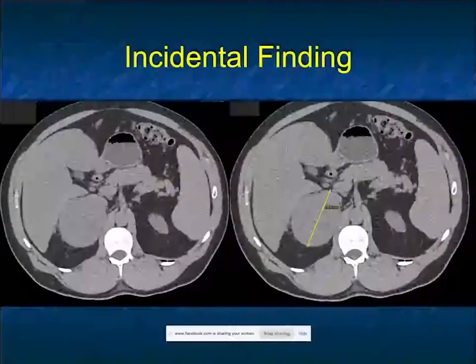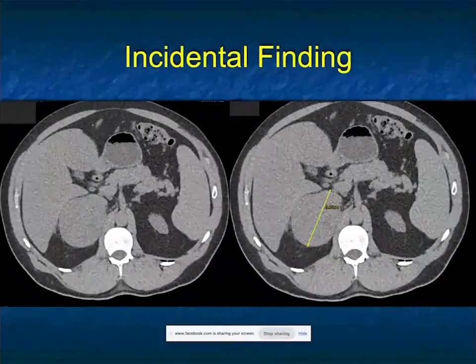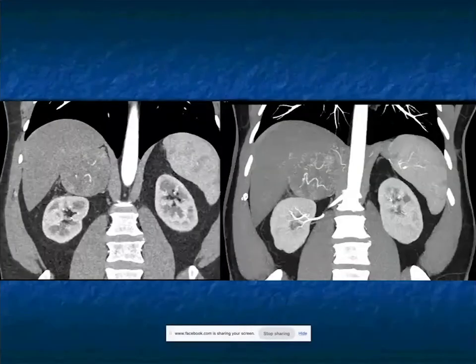Another case, right adrenal mass. It's solid, again, pheo, lymphoma possibly, often bilateral, ACC, solid mass. Give contrast, there's some prominent vascularity. Now, when I start seeing irregular vessels like this, I'm always thinking about neoplasm. I'm thinking about an ACC.